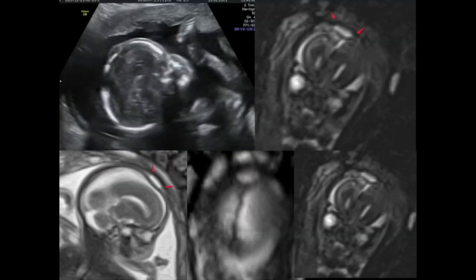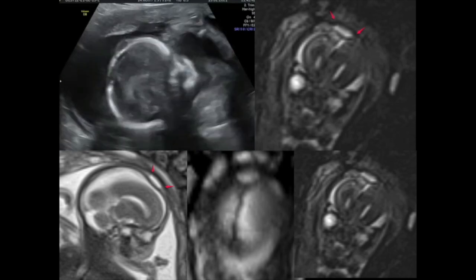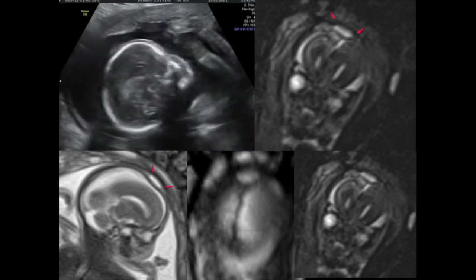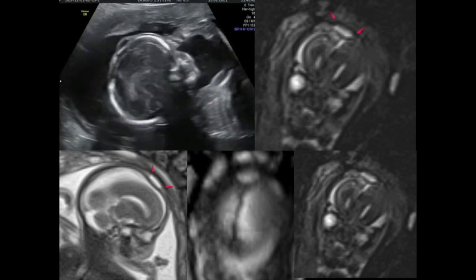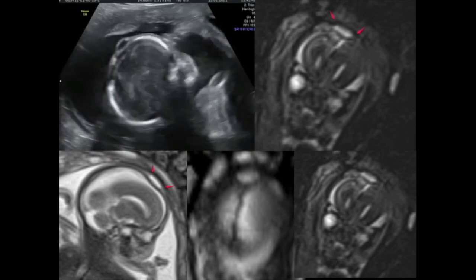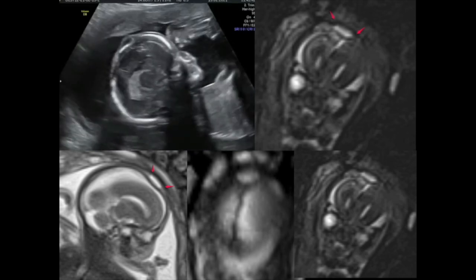If you look at the MRI, this lesion has no intracranial communication. If it is misinterpreted as an encephalocele, it may result in unnecessary termination of the pregnancy. Therefore, when you detect a lesion in the fetal scalp in the region of the anterior fontanelle without an intracranial communication, think of dermoid cyst as a major differential.